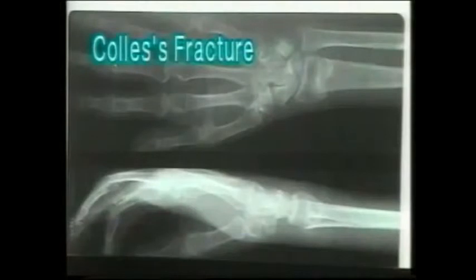This is a fracture at the junction of lower third and middle third of radius and ulna. This is a fracture of the middle third of radius and ulna. This is a typical Colles fracture of the lower end of radius with dorsal angulation.